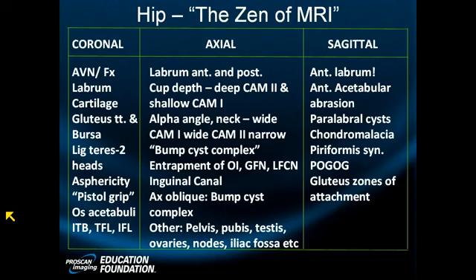When we get up all the way to the top, it closes. When we get to the bottom, in my experience, it's a little bit bigger. It's a little bit deeper. In my experience, the recesses tend to deepen as you go down. That is the classic anatomic teaching from years past, and that has been my experience.